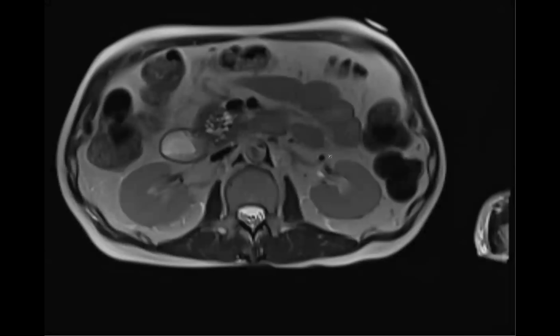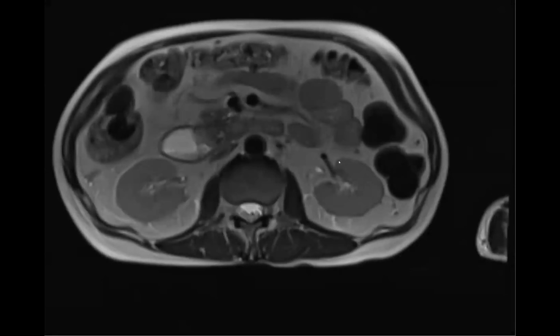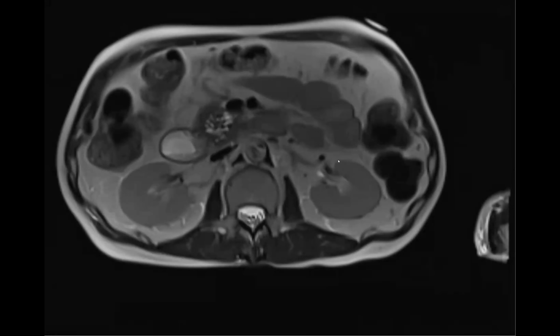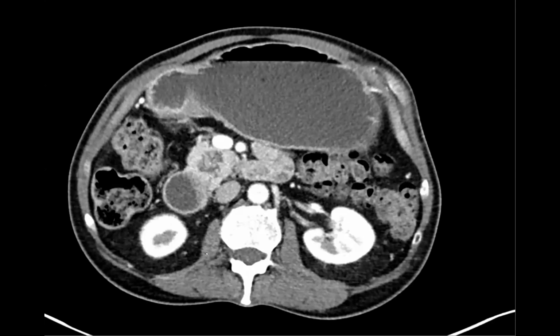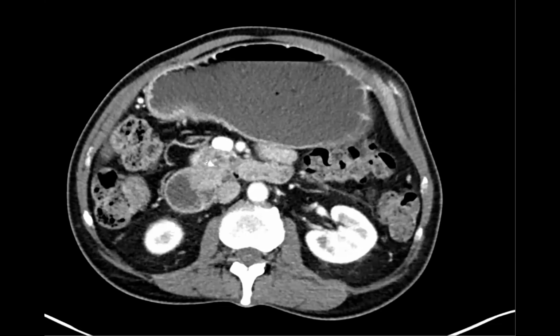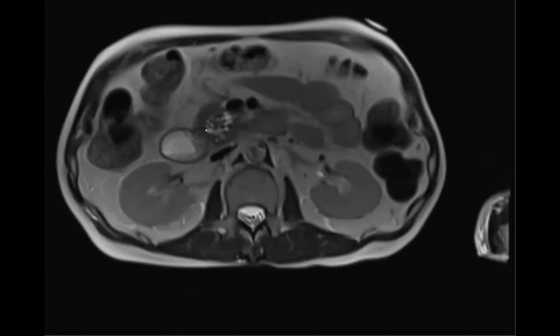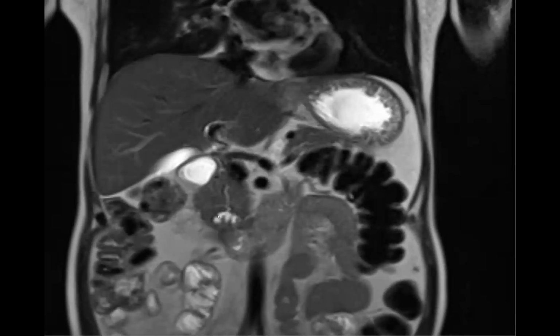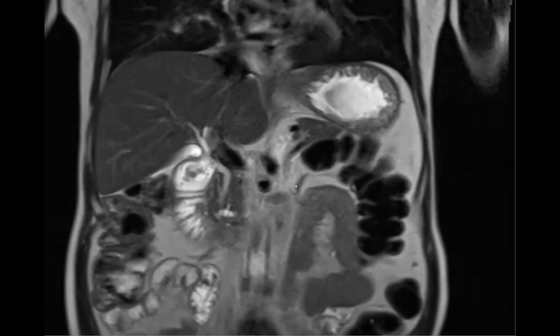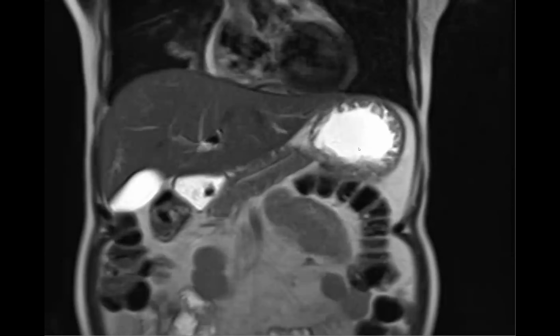There it is. Oh, interesting. It kind of looked like a serous cystadenoma on this. That's exactly one of the things we were thinking. So I'll say on this, we were like, is it pancreatic? It's got a central scar with calcification. Maybe it's a serous cystadenoma. We get the MR. It looks like a serous cystadenoma, but then we were like, you know, here it doesn't really look like a serous cystadenoma. And then why was the stomach so distended on that CT?